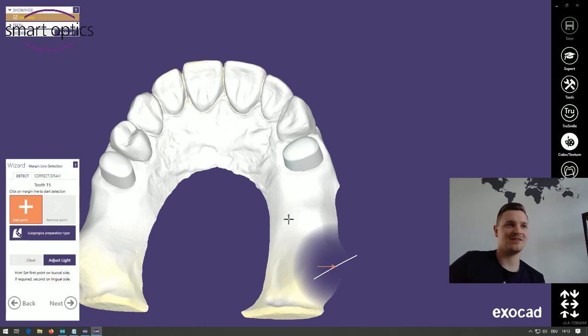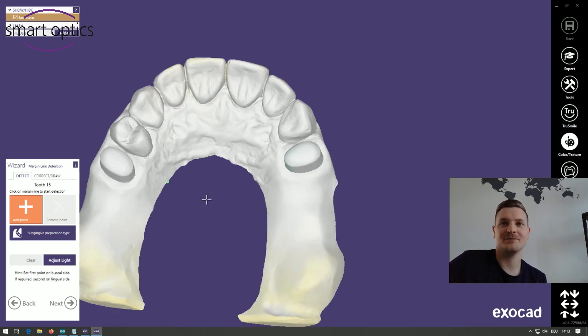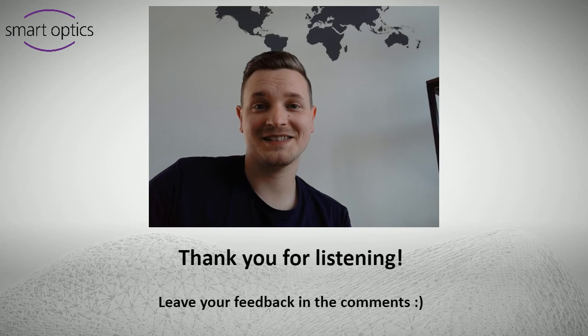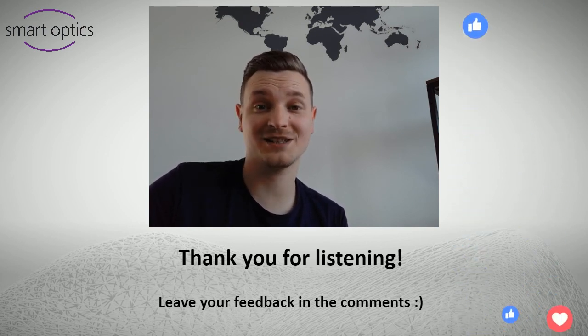Yeah, this was one simple way how to scan primary crowns on a master model, and hopefully I could help you with it.